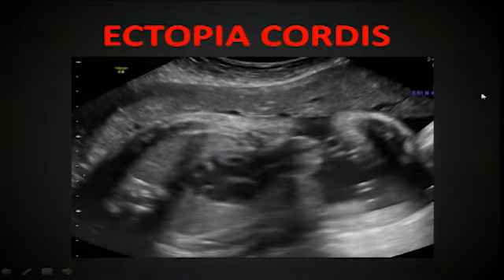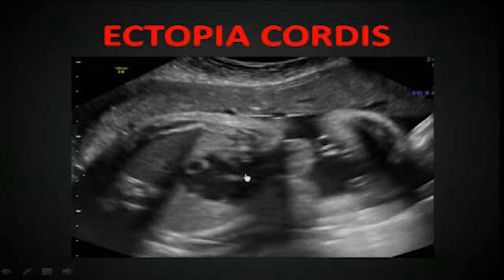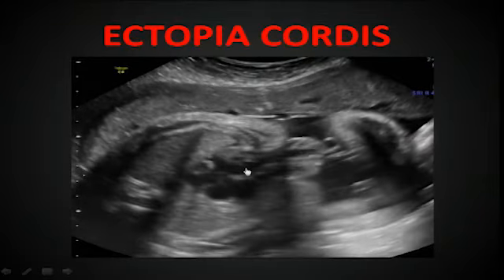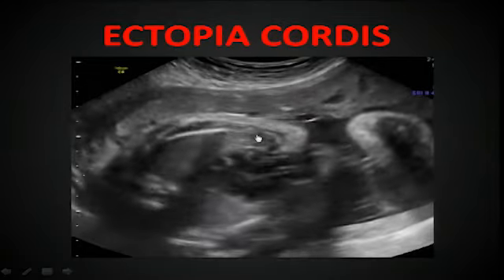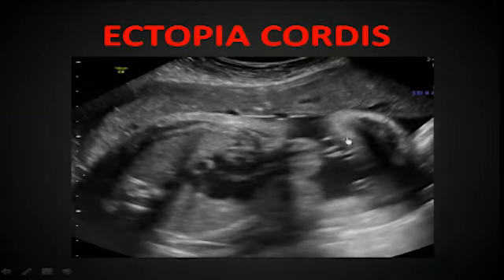So this is ectopia cordis. There's a sternal defect, a congenital abnormality of the sternum, a defect in that anterior chest wall, and the heart protruding through the anterior chest wall. Now the differential between this and pentalogy of Cantrell: pentalogy of Cantrell also has other abnormalities. This is all this baby had.